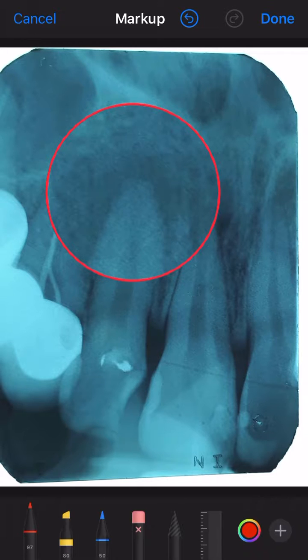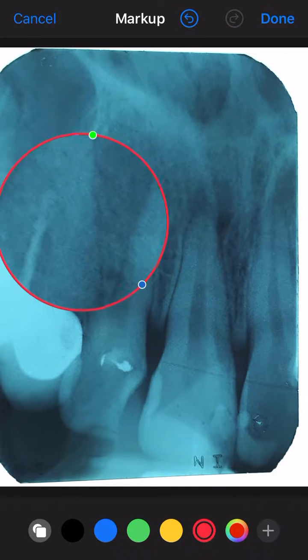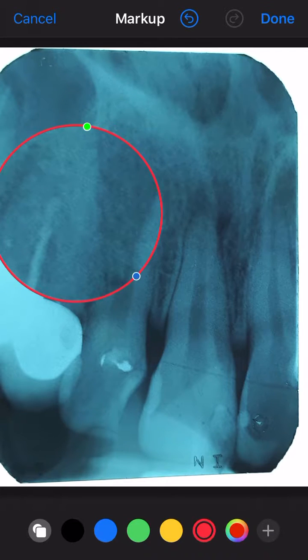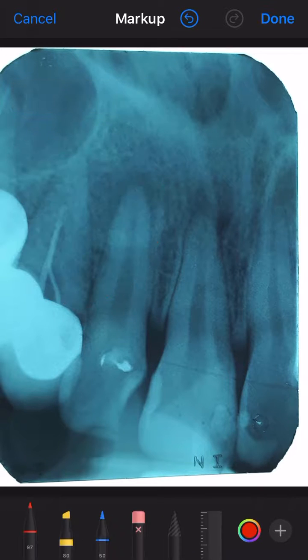So can we now discuss the diagnosis? Remove the magnifier. Yeah. Can we discuss the diagnosis for this radiograph? Yeah, for the central incisor. And for the lateral, well-defined radiolucency. For the central incisor, more likely to be a periapical granuloma. Okay, and what about the lateral incisor? Periapical abscess. Very good. So chronic, good.